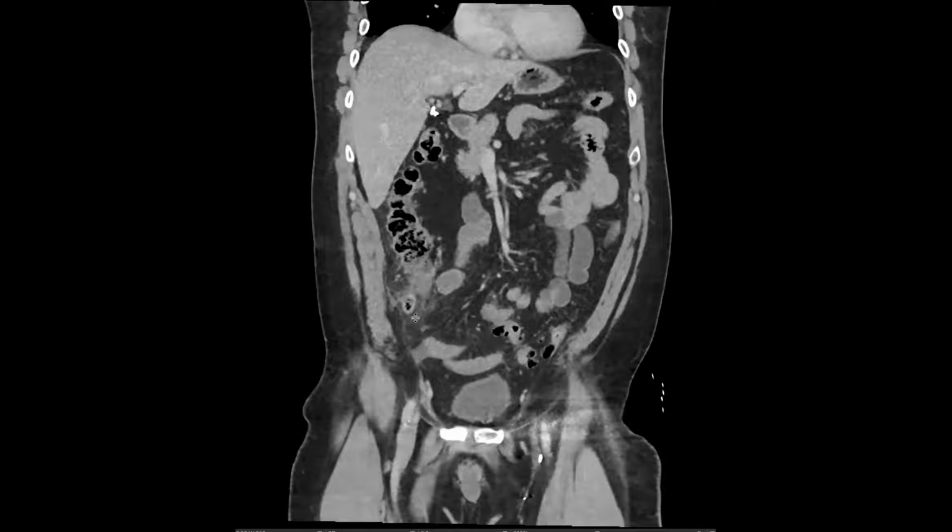But when there are features of appendicitis, which are present in this case, and then you see air within the lumen, it is no longer a sign of normalcy, it is a sign of suppurative appendicitis. Oh, because the air is coming from the infection itself instead of the luminal gas. Correct. Oh, gotcha. That's great. Good to know. I still think you did the right thing, and they can do it open and then make the decision intraoperatively as well. That's fair.